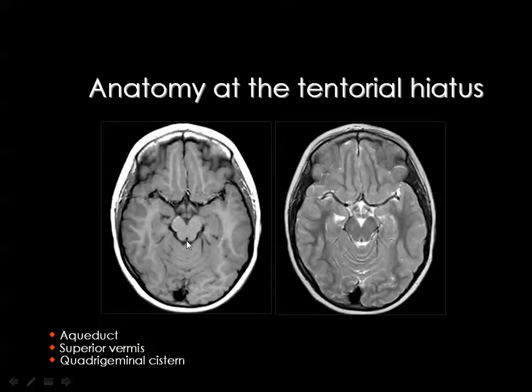And this dot represents the end of the fourth ventricle and the start of the aqueduct of Sylvius. And the aqueduct, as you all know, joins the fourth ventricle to the third one. Then here, this is the midbrain with the classic configuration, bordered posteriorly by the quadrigeminal cistern.